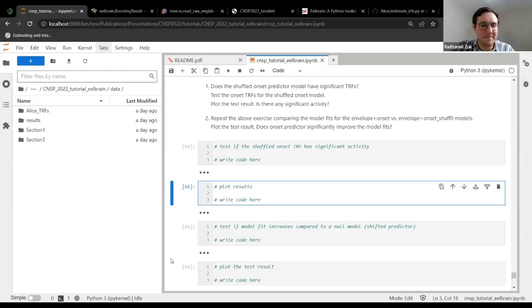Okay. But yeah, and these are doing it not just on single values, but on topographies or TRFs, right? So it has many. I found that it does the same thing on my computer as well. These should be optimized using Cython under Python, so it should be running on C code. That's sort of fast, but yeah.